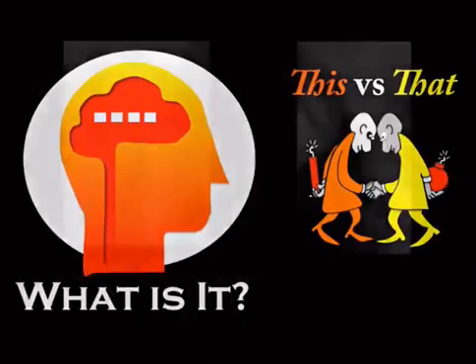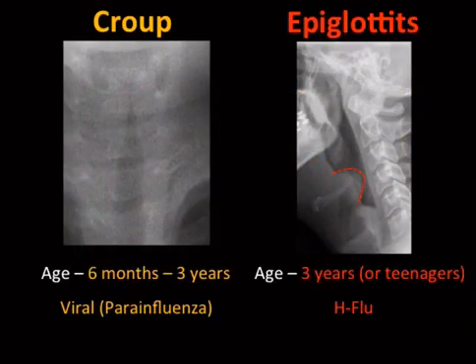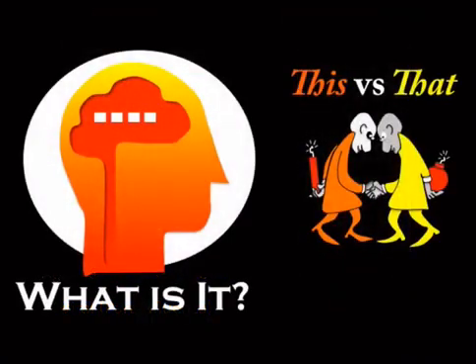Let me back up and make a point. That's for real life, by the way. For the purpose of multiple choice, steeple sign equals croup. And you are diagnosing croup on x-ray. And in everything else. All right, moving forward here.